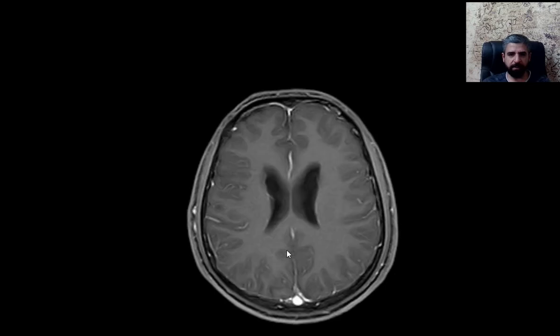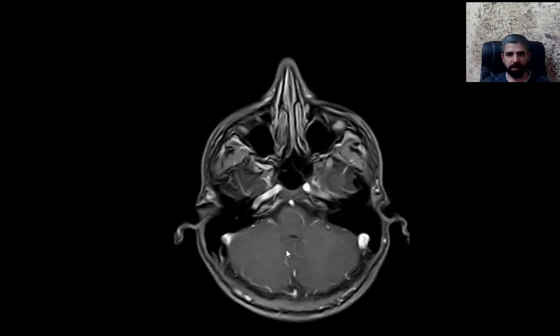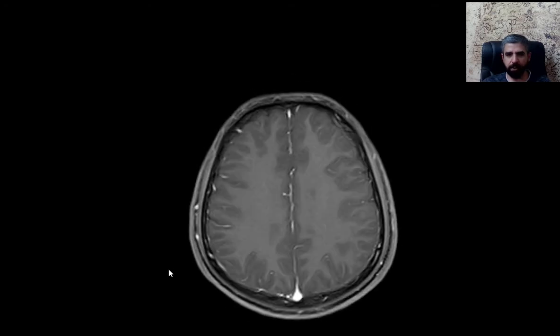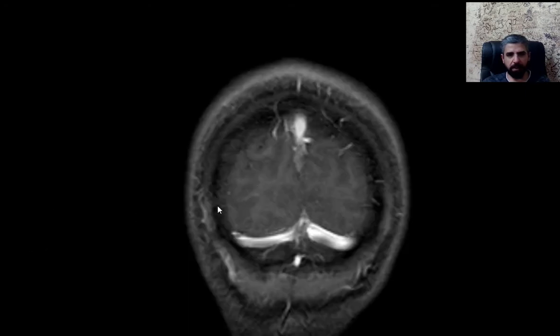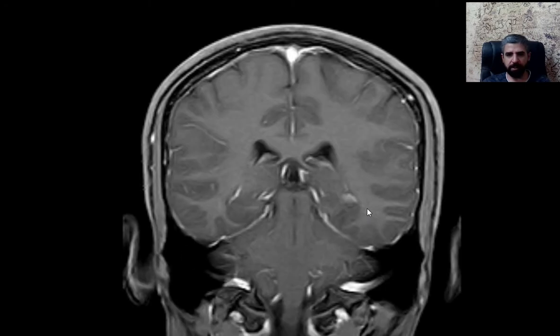I wonder if you find it or not till now. What is the abnormality, what does it mean, and where is it located? I'm just trying to show you, and I will not give you any hints today. If you want to know, then you have to wait till tomorrow for the answer and the explanation.